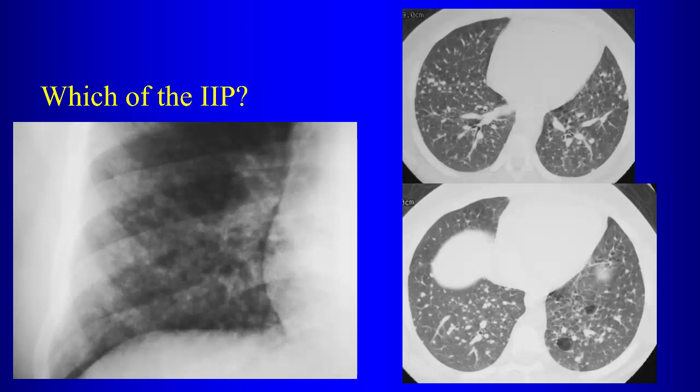Maybe perilymphatic here, but is there another finding on the CT? Is there anything else on the CT? Mucoid impaction. Where do you see mucoid impaction on the CT? For mucoid impaction, we look for branching tubular opacities, right, that we don't think are blood vessels. So where do you think you see mucoid impaction here?